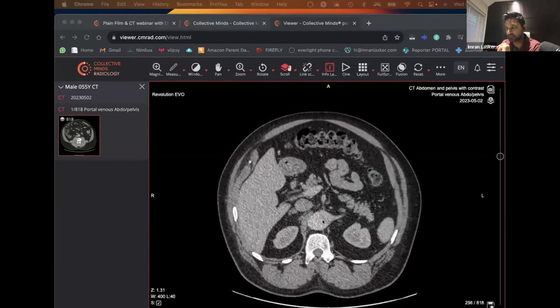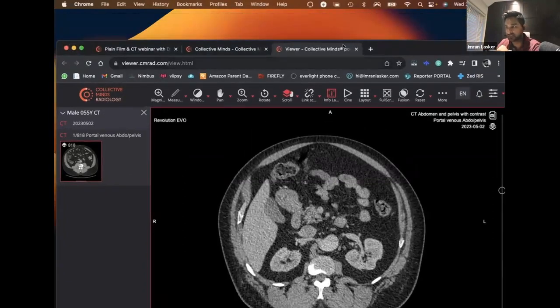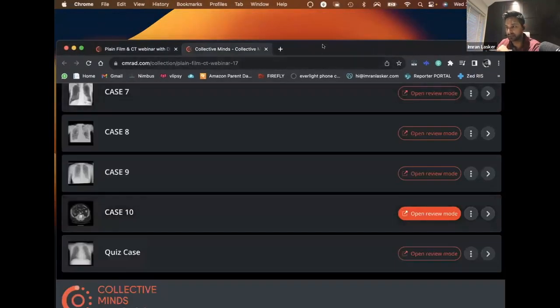The other thing that can help sometimes is you get atherosclerosis with the aorta. Sometimes the atherosclerosis will be pulled inwards, and so you'll see this linear bit of calcification, and then on the outside of that, you see some contrast. So you'll be able to say that anything inner to that calcific density is going to be the normal lumen, and anything outside of that is going to be false lumen. That's another way to try and identify which one is which. So those are some pretty decent signs to look for when you're doing that.